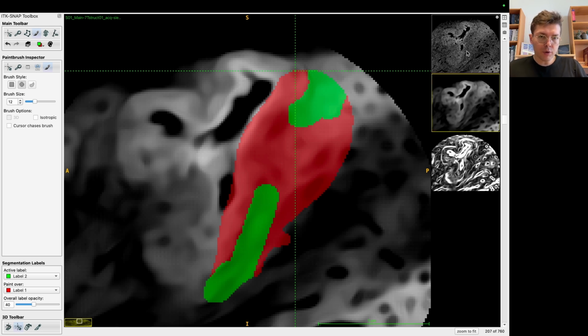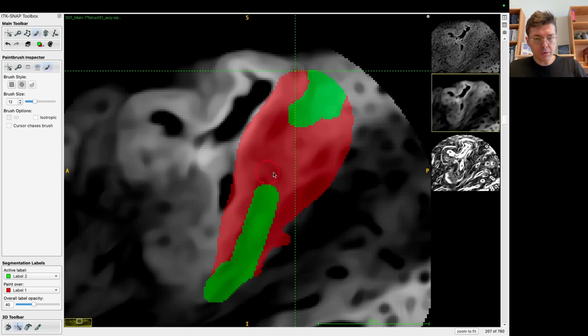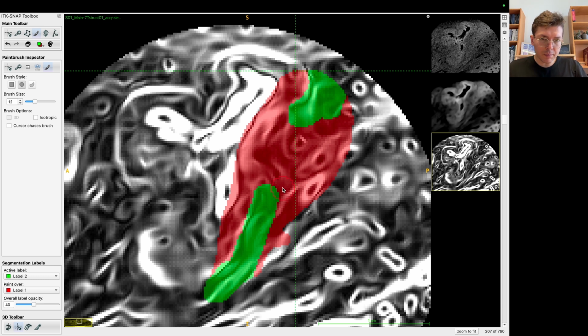And in between, I try to get a more informed opinion by going through other images like this one. It's really not visible. This one is also really hard. I look at the gradient magnitude. I see that there is a little bit more, like maybe like this. It's a bit tricky, but in those cases, just try to follow the same thickness as you had in the rest of the parts that you can see.